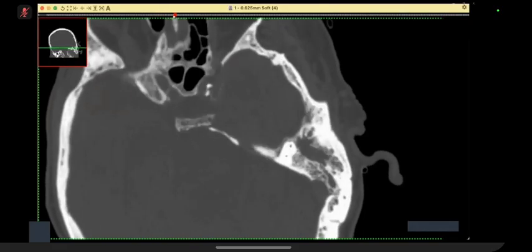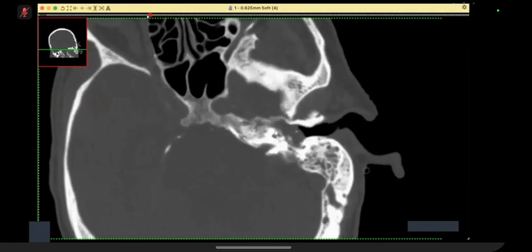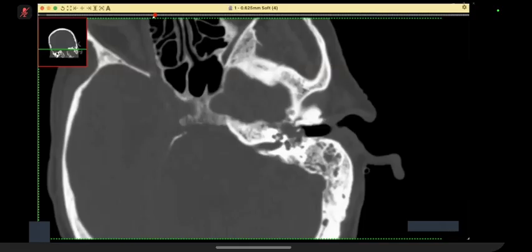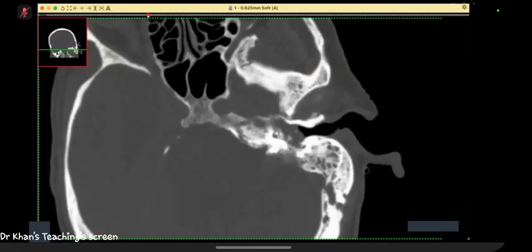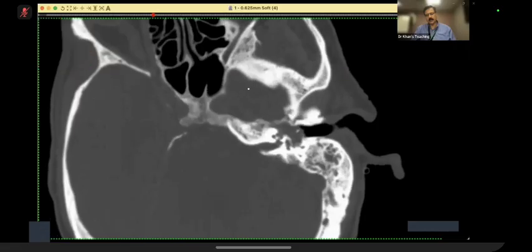Yes, this is the cochlea, the turns of the cochlea. I think there is a fistula with the cochlea here. Where is it? Point it out. This area? Okay. Well done. We stop here. Okay, doctor.